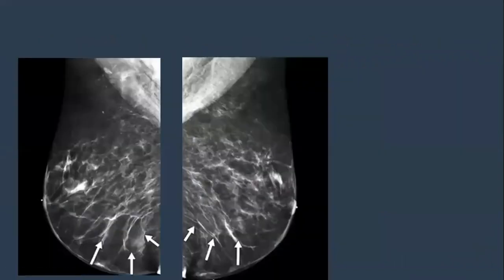I need a volunteer other than hint to tell me what is this, what do these arrows point to, and why this shape looks like that. And what else features might give a clue about this case, helping us to solve the case.